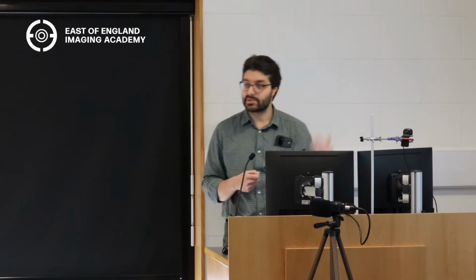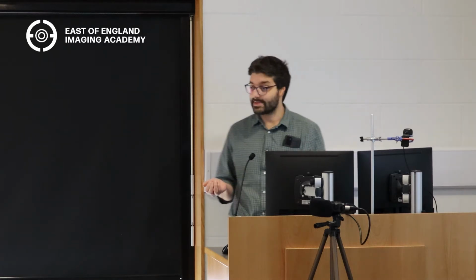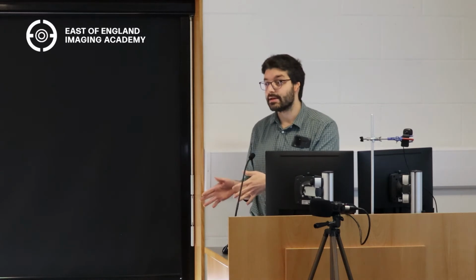So understanding contrast phases helps you to understand why we do a triple phase scan or dual phase scan or whatever else. Does that make sense? Yeah. There are all sorts of other reasons why you might want to do a triple phase. So, for example, if you're looking at the pancreas and you're looking for pancreatic tumors, well, some pancreatic tumors, like adenocarcinomas, are hypovascular. Okay, so they don't contain as many blood vessels, right?